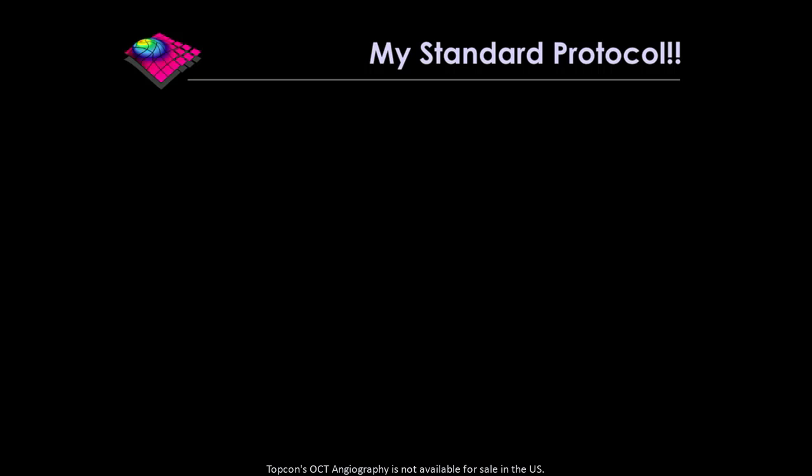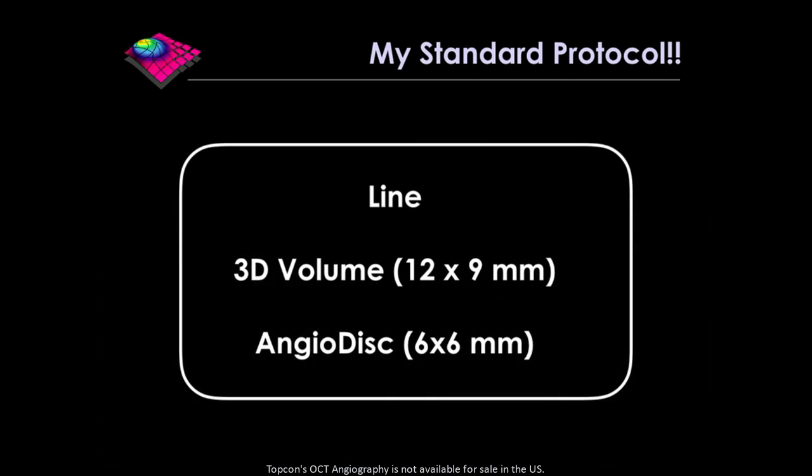Now, this is what I've worked out, but I also acknowledge that the software is getting better at such a rapid pace that I may get suggestions after this talk of better ways to do it, but this is what I've been doing.